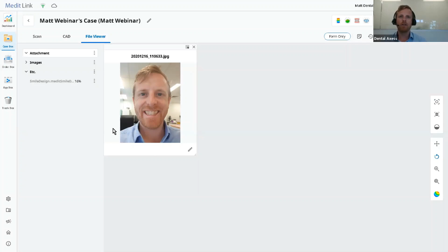And these are great tools that you can use to work with the patient. If the patient's in the chair right there, you can work on this. If you're a clinician wanting to get into this sort of work, you can do this here and now. It only takes 5 or 10 minutes.